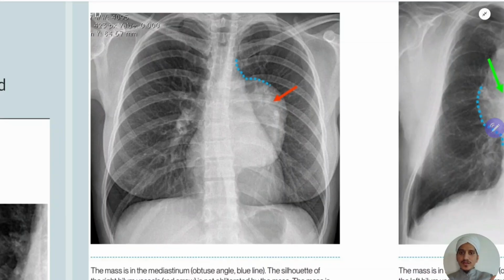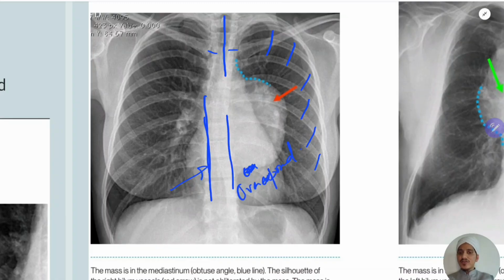So this is equidistant from the clavicles. Okay, and the intercostal spaces are okay, or you can count them 1 2 3 4 5 6. So it is good inspiration, and the vertebrae are very well visible now. Very well. I think it is overexposed chest X-ray. Okay, that is the technical quality.